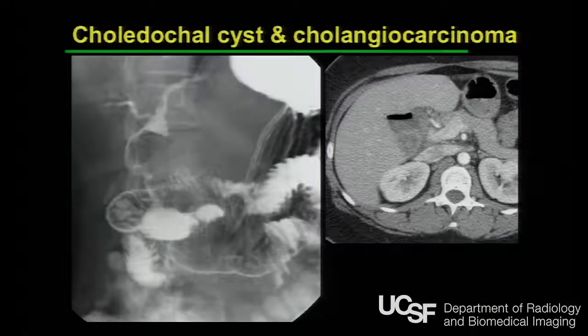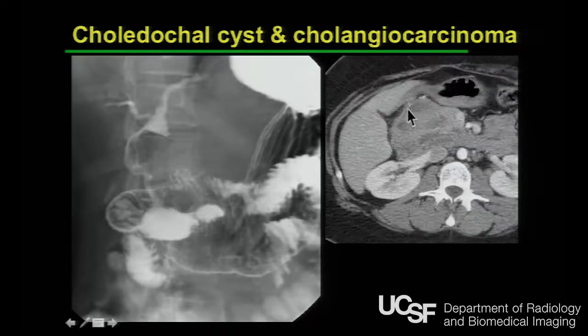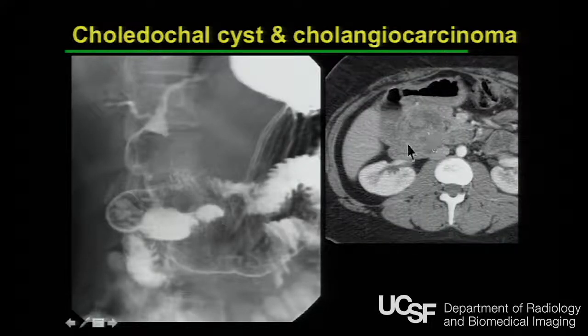And about one case every year, every other year, we're decreasing in frequency, we see a case like this. This is a beautiful 33-year-old woman. As a baby, she had a choledochal cyst. You can imagine, here's the other wall of it, this large choledochal cyst, reanastomosed to her duodenum. They did not resect the entire choledochal cyst. And so she came back at a young age with this enormous cholangiocarcinoma that was then untreatable.